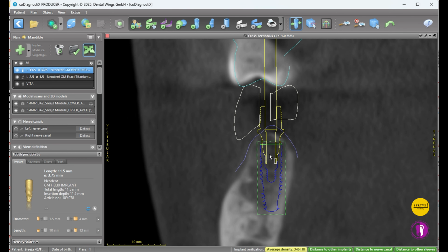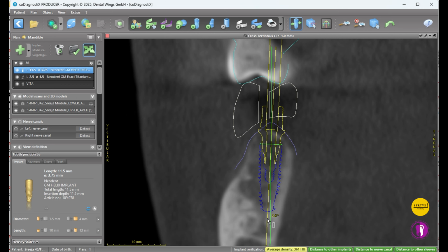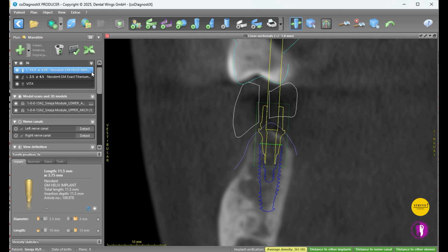Okay, yeah. Now you can adjust it in such a way that it is at least 3 millimeter below the level of the soft tissue is what we are looking at. Okay, and at the same time we want at least a millimeter of bone on the buccal side. Since all these implants are already incorporated with platform shifting, that will be really good.